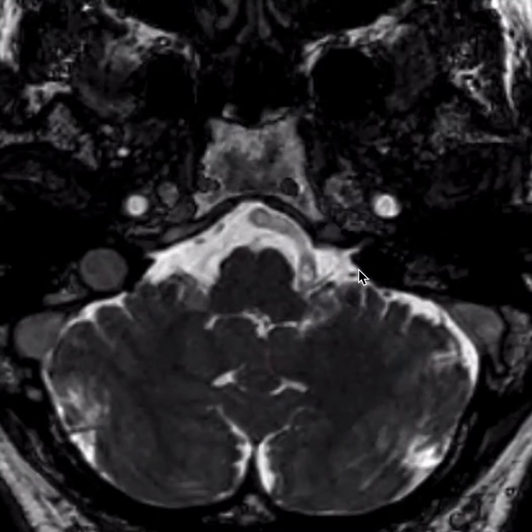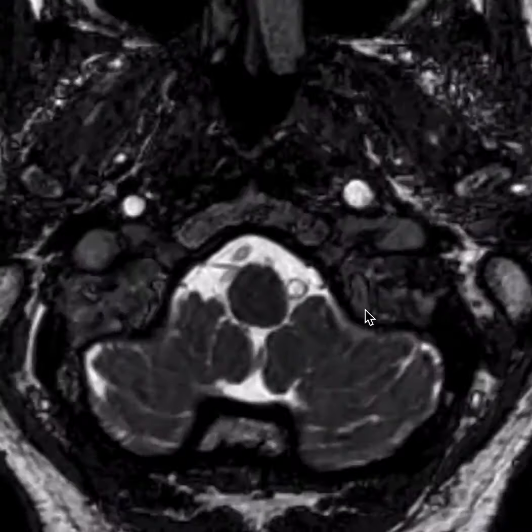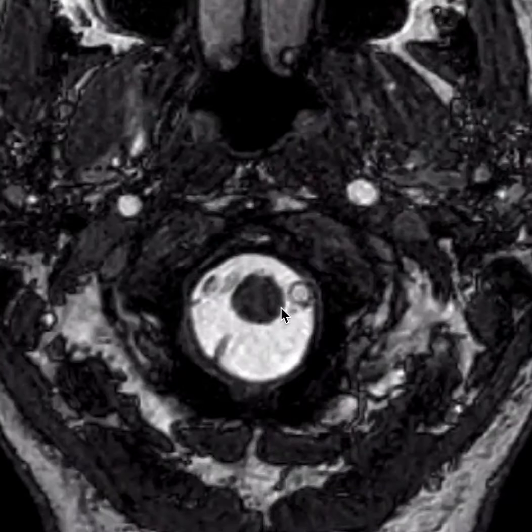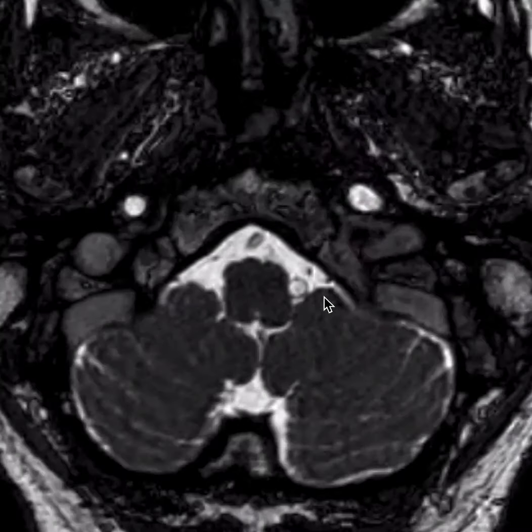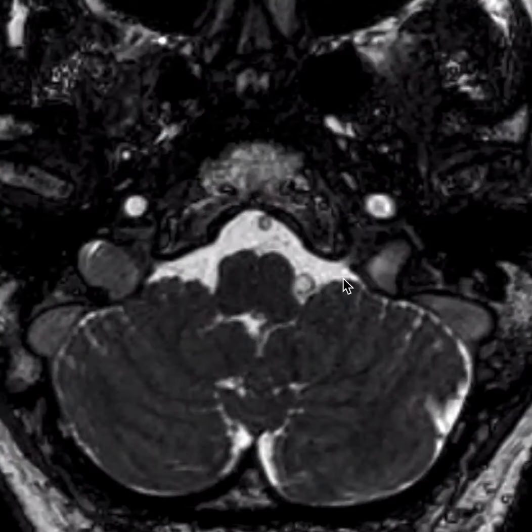As I continue to scroll down, I'm going to notice additional branches that come off of the medulla, plus some that come all the way down off of the cervical portion of the spinal cord down here. The accessory nerve, cranial nerve 11, has components coming off the cervical cord right down here, which go through the foramen magnum and converge with additional intracranial rootlets. They stay behind the vertebral artery right here and make their way superiorly and get through the jugular foramen. They course more inferiorly and posteriorly than do the glossopharyngeal and vagus nerve roots.